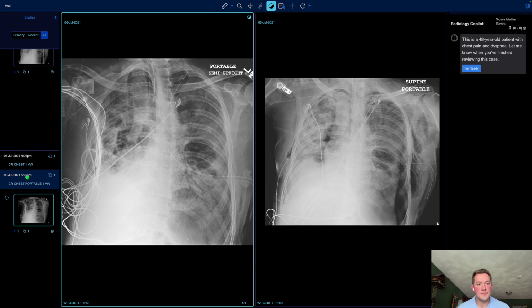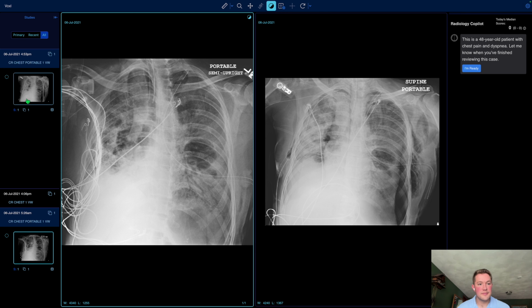And this has been the same day, 5 a.m. until roughly 5 p.m. In 12 hours, things got worse. And so I think that re-expansion pulmonary edema possibility is real, just adding on top of whatever else was going on in the alveolar spaces here.